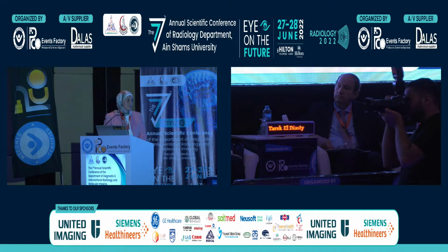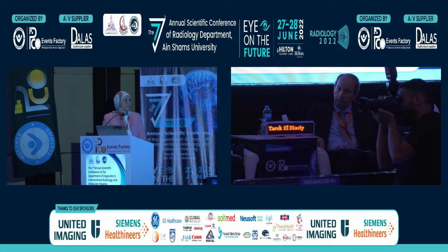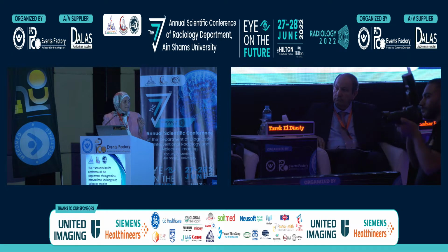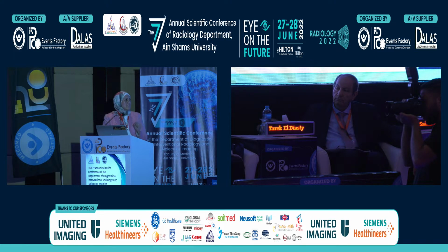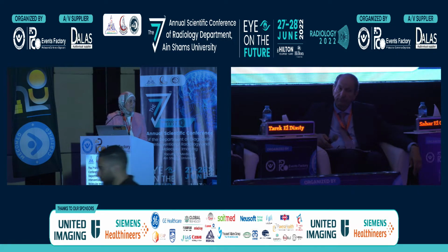Sometimes contrast injection is helpful in discriminating VIRADS 3 lesions and also VIRADS 4 lesions, because the interruption of the mucosa on the dynamic study, enhancing mucosa, is more sensitive than the diffusion, because we can't discriminate whether it is extending deeply into the muscle or not. But on the DCE it is very easy to identify the disruption of the mucosal enhancement.